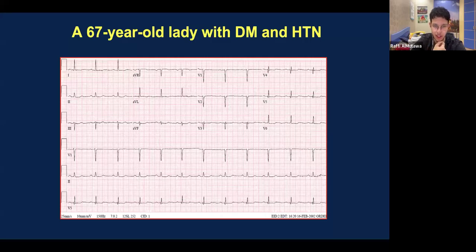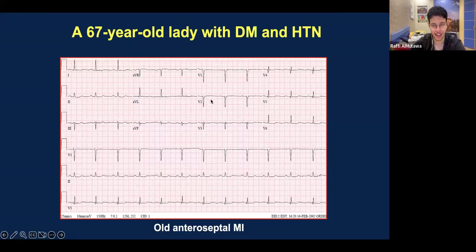Over here, what do you guys think is going on? Q waves. Yes, this is an old MI. Exactly.